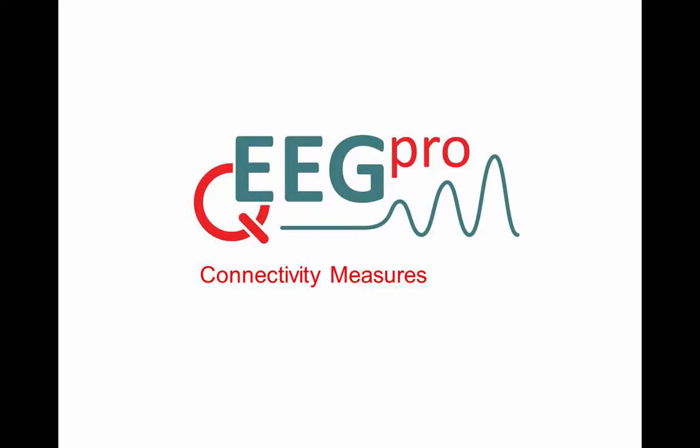Connectivity measures. When assessing the brain activity of a patient, it is not only relevant to see what the deviations are in a particular brain area, but also whether there are deviations in the communication between brain areas. QEEG Pro distinguishes three ways of assessing communication between brain areas. The first two measures are based on the phase between electrode sites, phase coherence and phase lag.